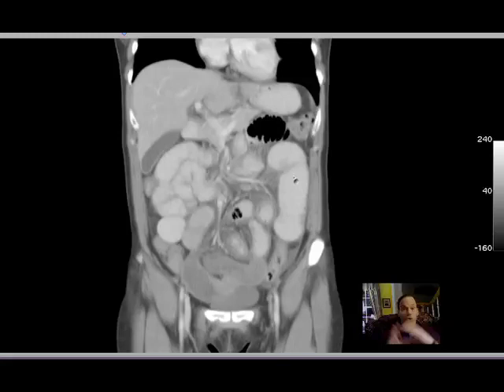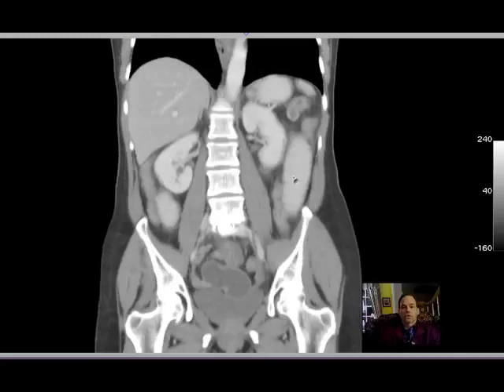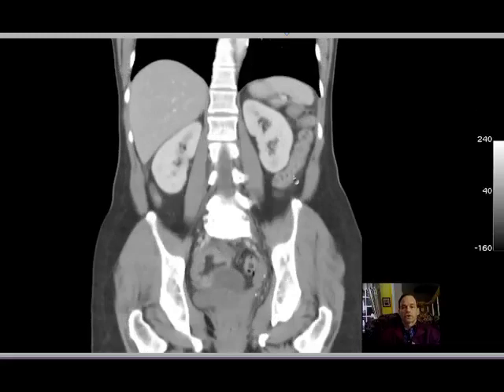The bowel doesn't know where the obstruction is, so it just increases peristaltic activity, and therefore anything distal to the level of obstruction tends to get pushed out. So the small bowel distal to an obstruction and the colon tend to be of reduced caliber.